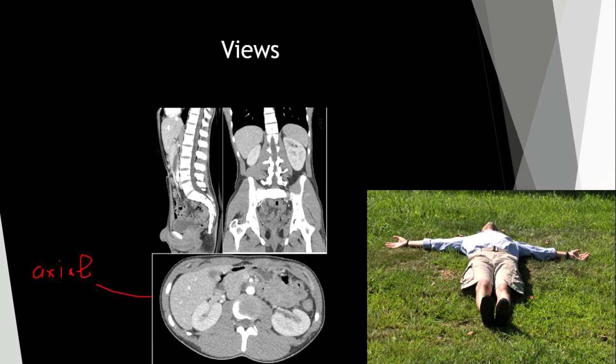As I pictured this person here, how do we look at every CT in axial view? We look at this CT like at a lying human, from his feet.